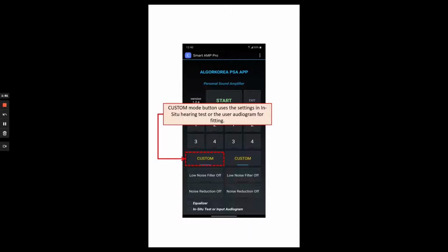As you can see, both the left and the right sides are on. A way that you can know that these buttons are on is when the words are yellow and a blue light has lit up in the bar below it.